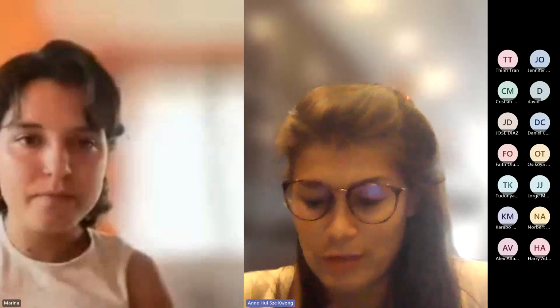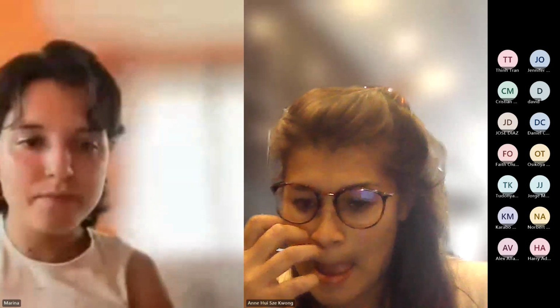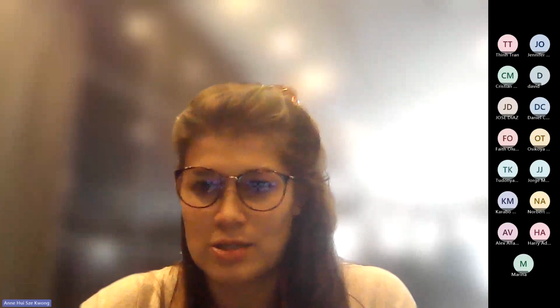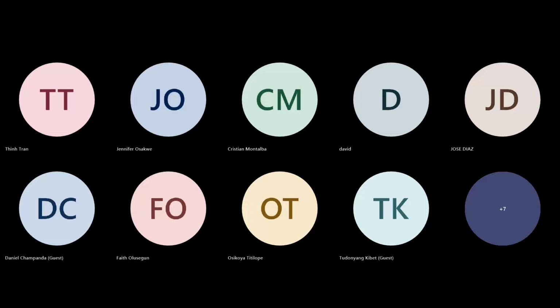All right, so I will do a demo specifically for 4D Flow today. And of course, if you have any question during the session, you can interrupt myself and ask question. So I will just share my screen in a few seconds.